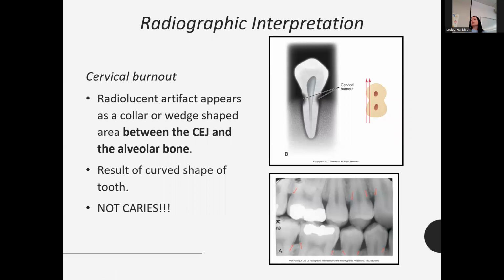Okay, so cervical burnout. We have one example of it in the worksheet in lab, but we didn't actually get to explain what this is. With the anatomy of a tooth, a lot of the teeth are kidney bean shaped, or the root has mesial and distal root depressions. You've learned about that in McGee's class. Those are good to know because when you're scaling, you need to turn your toe into those depressions. A lot of times calculus will build up there.